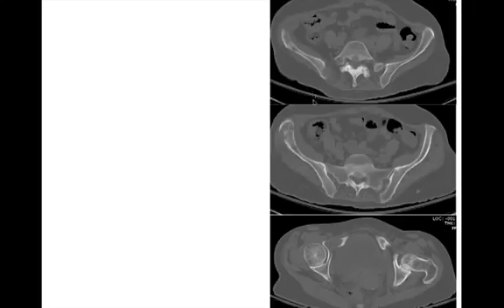Okay, three cuts from the same CTs, multiple lytic lesions. These are scary lesions, right? There's some cortical breakthrough and cortical destruction associated with them. They're geographic, but they probably have a wider zone of transition, one here as well too. So we're going to think scary things. Again, what's common? Mets, myeloma are common. These turned out to be metastasis from breast cancer.